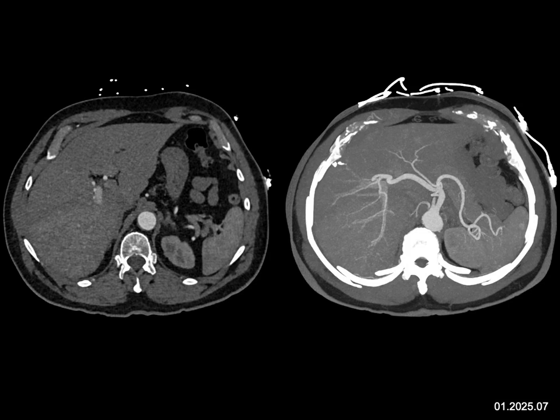Cholangiocarcinomas typically are associated with dilated ducts and are hypovascular, so I don't like a cholangio for this one. Colon cancer metastatic is typically hypovascular. This lesion is just too vascular. With metastatic colon, you'll typically see the lesions better or best or only on the patient's venous phase, not arterial phase. But you can see them in arterial, but they're not going to be vascular like this case. Metastatic neuroendocrine tumors are often vascular, but typically more vascular than this.